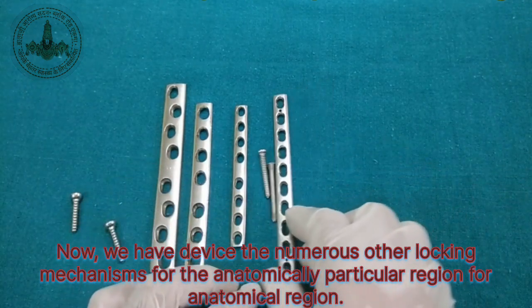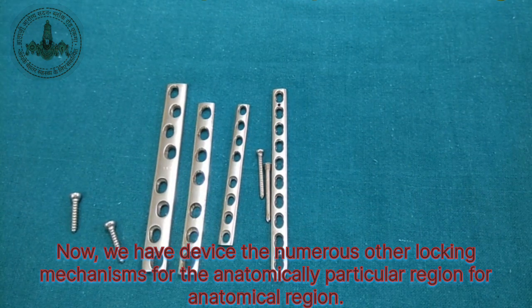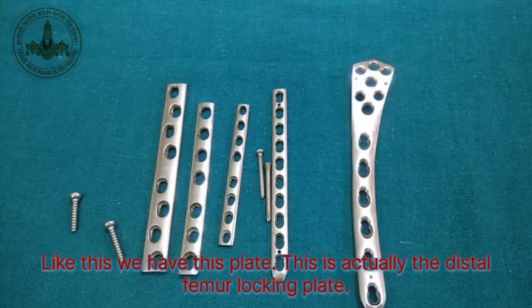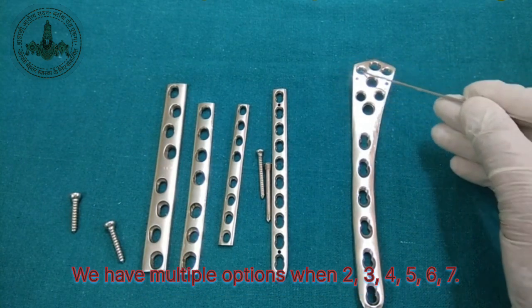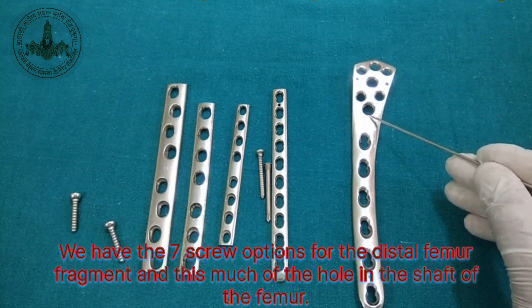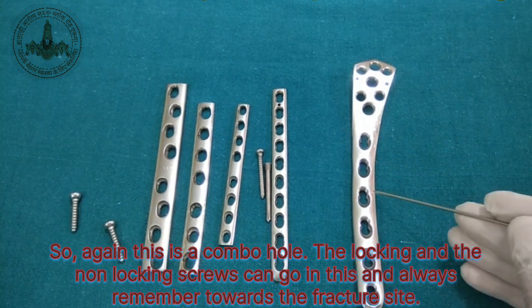Now we have devised numerous other locking mechanisms for particular anatomical regions. For an anatomical region like this, we have this plate. This is actually the distal femur locking plate, the distal femur locking compression plate. This is for the distal femur fragment. We have multiple options, 1, 2, 3, 4, 5, 6, 7. We have 7 screw options for the distal femur fragment, and this many holes in the shaft of the femur. So again, this is a combi hole.